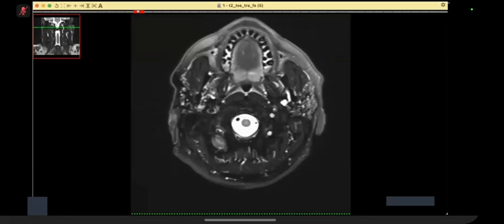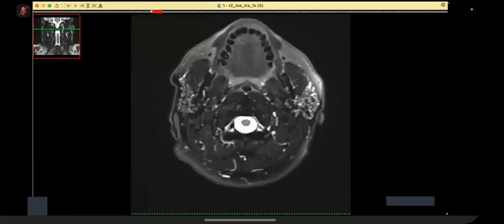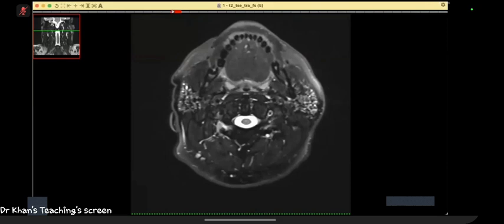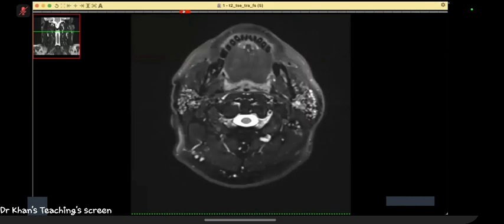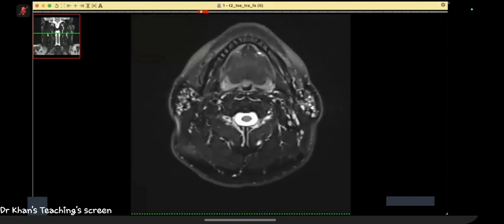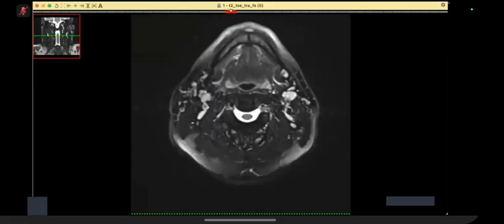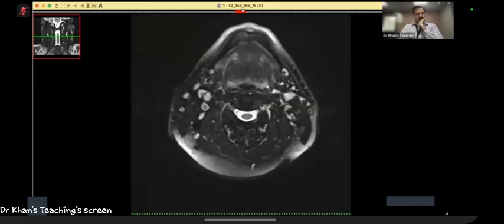I'm just going to review the symptomatic region of the neck now. I cannot see any abnormality in the submandibular region or floor of mouth. I'm just going to carefully assess the neck region. Please look at the parotid glands. Yeah.